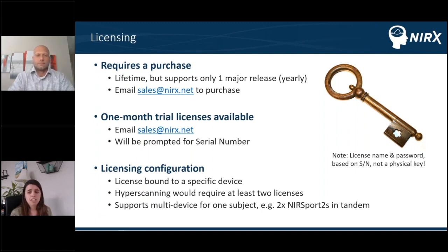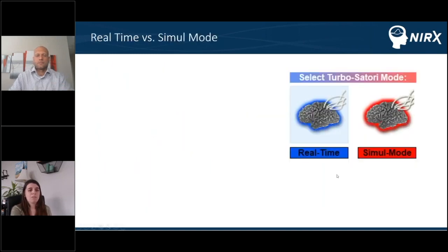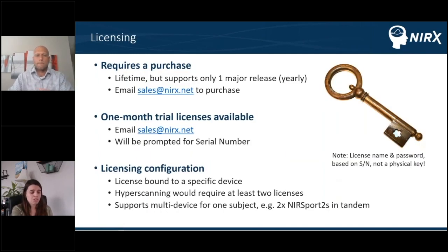A note on the licensing: the license name and password are not a physical key. It's not like a dongle. It's going to be a username and password combination. And if you have any questions about the licensing, please shoot the question in the question box, and we'll be sure to answer it.